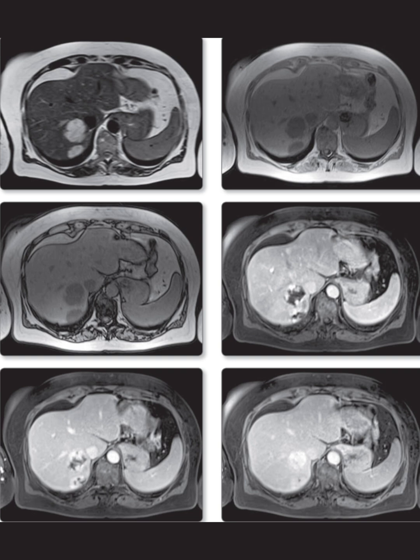When we switch to the non-contrast T1 weighted images, we observe that one of the lesions shows the Indian ink artifact, which is typical of out-of-phase images. This artifact indicates a loss of signal at the interface of tissues with different magnetic properties, but in this case, there is no significant loss of signal intensity, which is notable.